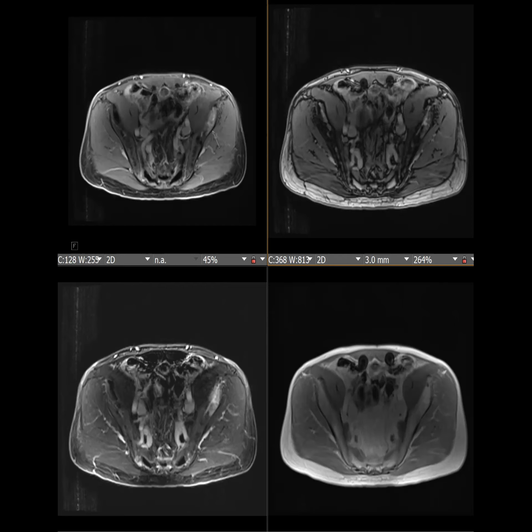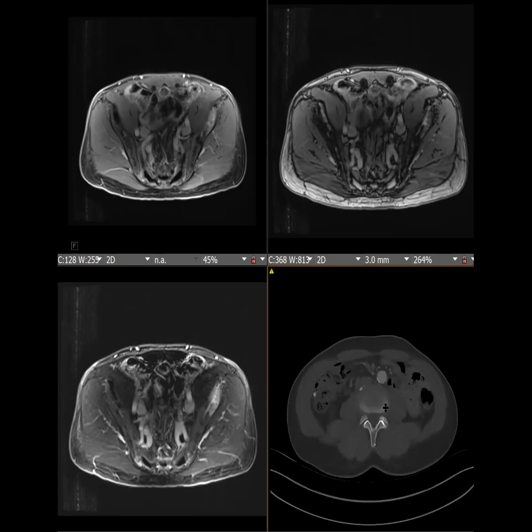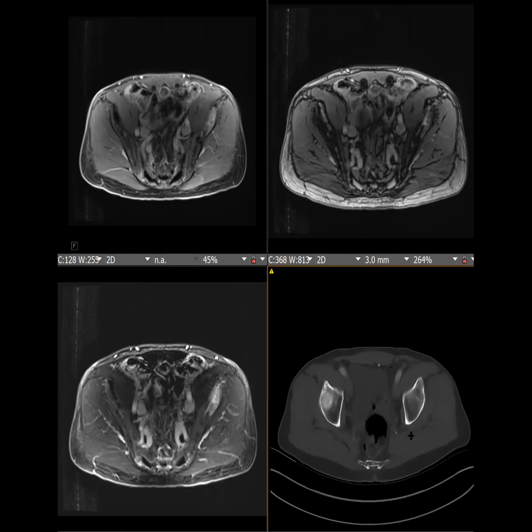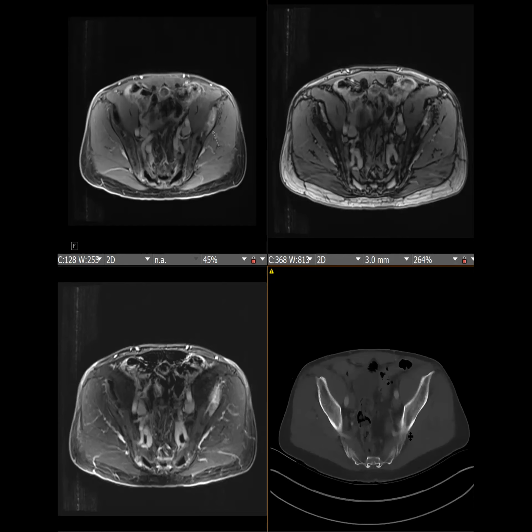That's really cool. I was actually wondering if you could see the hemangioma on the CT, because my MSK colleagues have told me that pelvic hemangiomas are rarer than lumbar ones, but also possible. So we should think about those. Could you see them? I'm actually going to try. When we were looking at it, we really couldn't see the lesion well, but it's somewhere in this region. On CT, it's not really well seen.